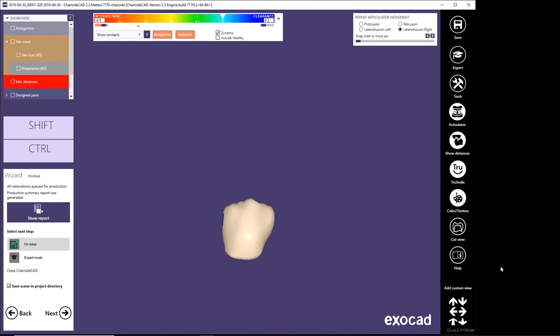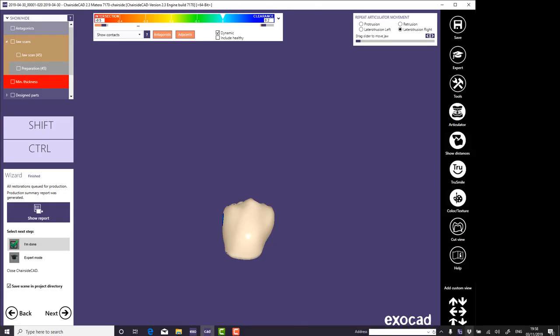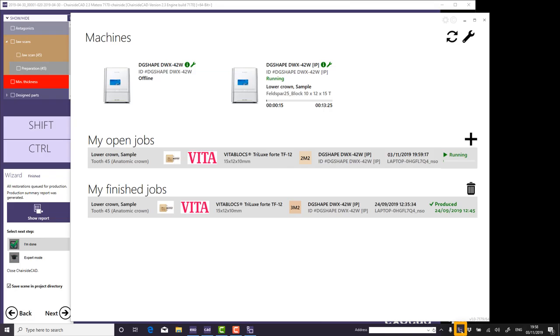Machine Tray Tool is a software application for storing, scheduling, displaying, and transferring dental CAM jobs. It allows you to control the assignments and the production queue to individual machines from your computer.